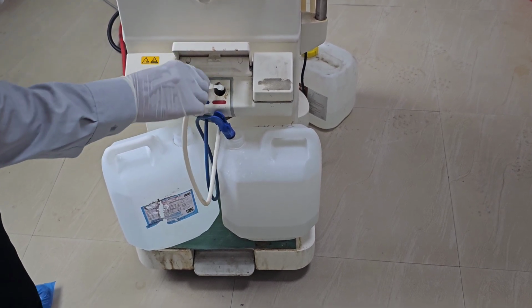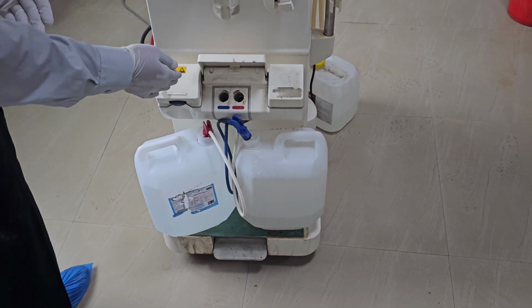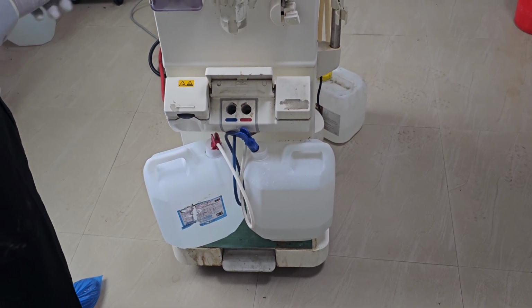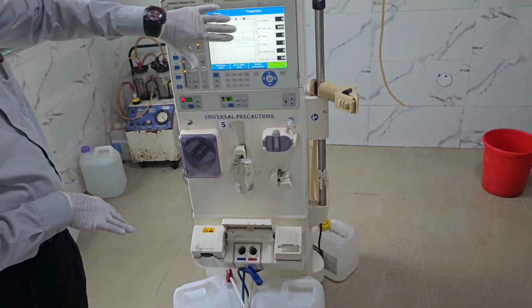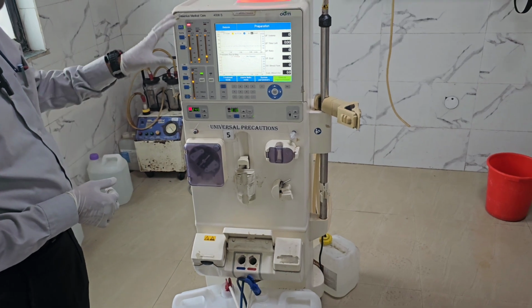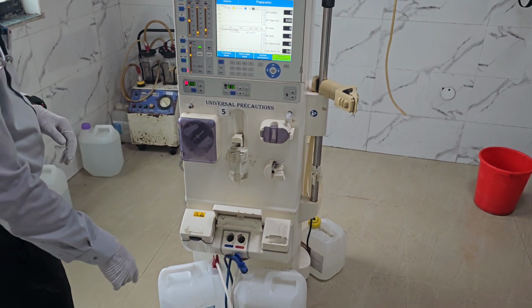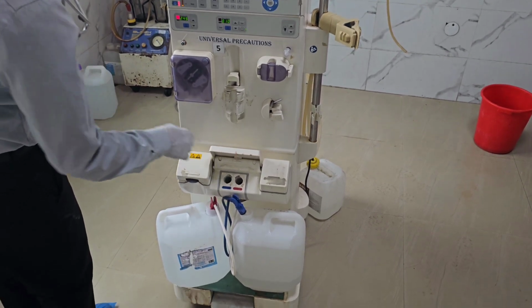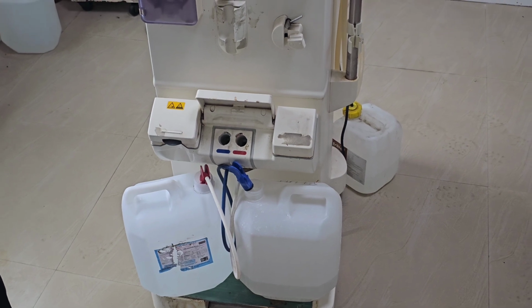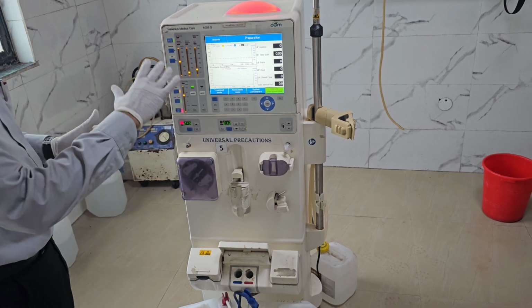Once the dialysis is started, this has to be taken and put in the respective can. And the color code will be specific for a particular machine. So in the extracorporeal circuit, what we have seen is the operating panel, blood pump adjuster, various buttons, air detector, heparin pump, part A and part B connectors. These are the part A and part B cans, pressure monitors. So this completes the front view parts of this machine.